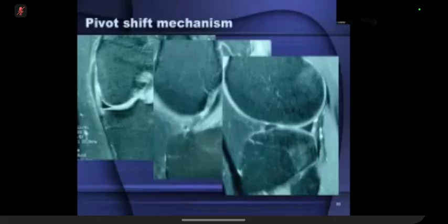of the important associations. I think most of you should be able to pick up the ACL injury, but look for the subtle sprains of the medial collateral ligament and the characteristic bone bruising pattern. All of those findings would need to be mentioned to get the maximum points.